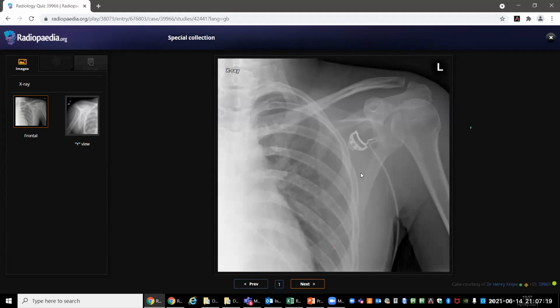I haven't. Yeah, so this is actually a case of pneumothorax. So please look very well before you say there's no pneumothorax. It's a bit subtle, but it's there. Can you see the pleural edge? Oh, now I can see it. Sorry, it's very subtle. There's no other abnormality here. That's the only abnormality. So it was a pneumothorax. You could have asked for history, that might have helped.